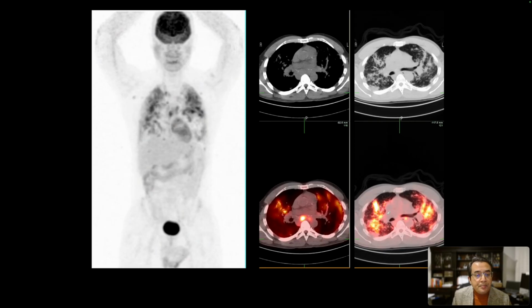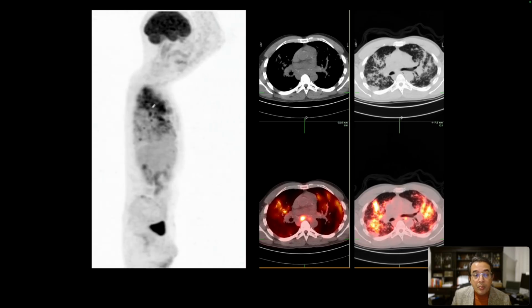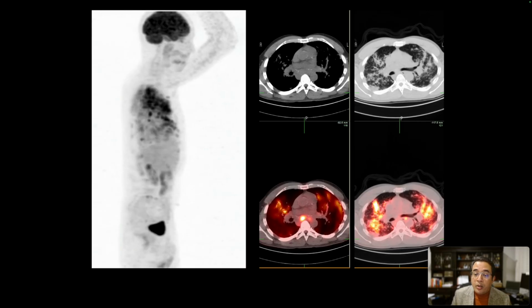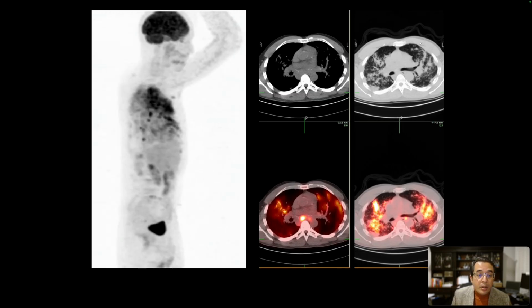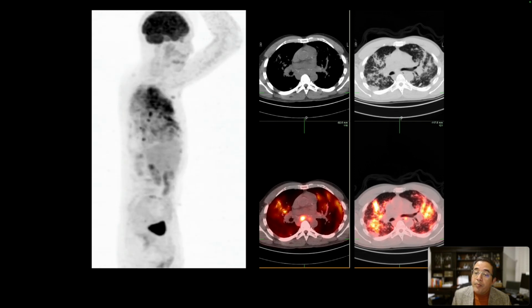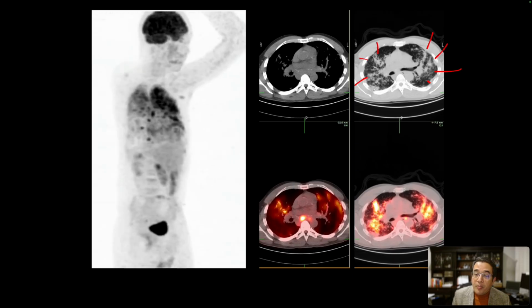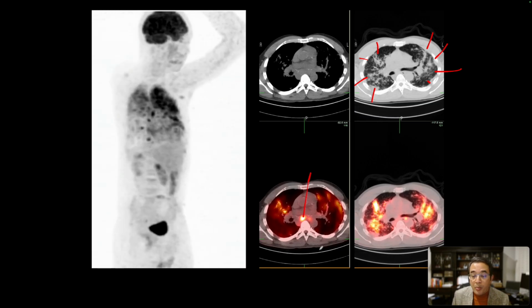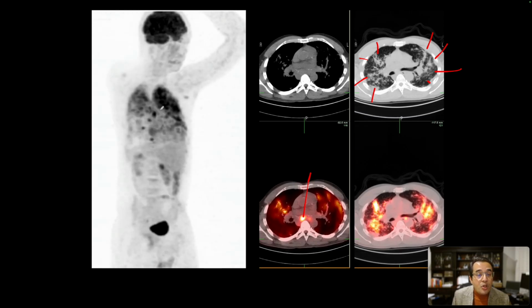This next patient was being evaluated with FDG PET CT, and we see these multiple foci of increased uptake in both lungs in a symmetric fashion. And on their images of the chest, in lung windows, we find that there are opacities, there are consolidations in a symmetric pattern involving bilateral upper lobes. There's also hypermetabolism seen in a subcarinal lymph node. This patient had tuberculosis showing FDG uptake.